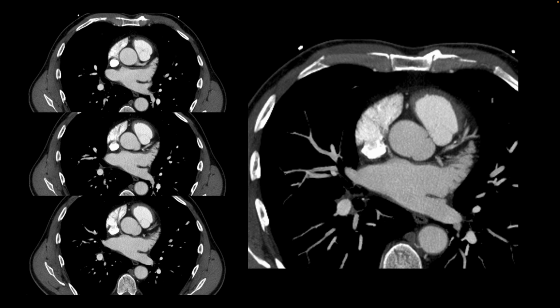This is our next patient where their chest pain was later attributed to coronary artery disease. And these are some axial images. And this one is blown up because this best shows the narrowing that is seen in the mid LAD. We have a plaque that causes narrowing of the LAD, and this plaque is calcified and non-calcified. So remember, these patients can present with chest pain from coronary artery disease or angina.